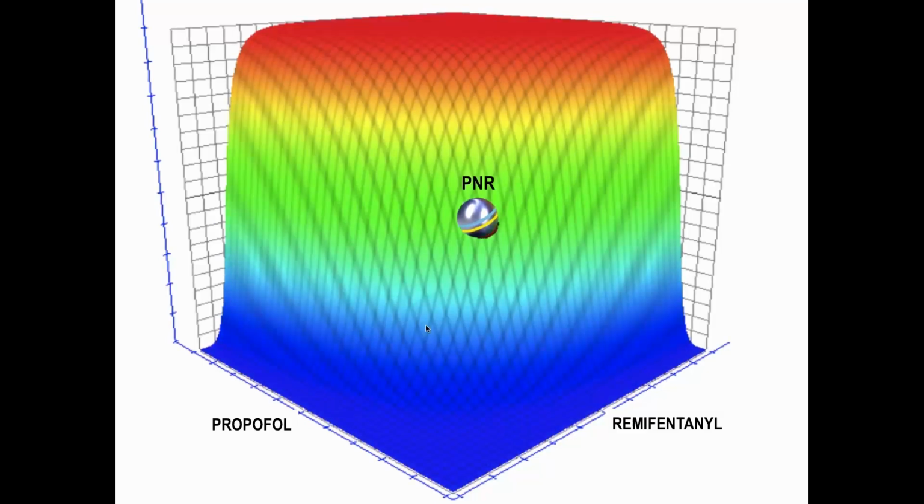Tacan 3D is the first software that incorporates the surface model in 3D, where the administration of anesthesia is transformed into a concept of 2 variables, space as a function of time. Tacan 3D is an innovative software where the anesthesiologist can select a point in the space or in the surface model and determine the time in which he wants to reach that point.